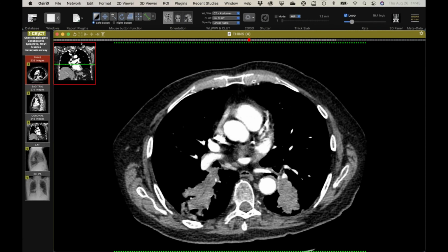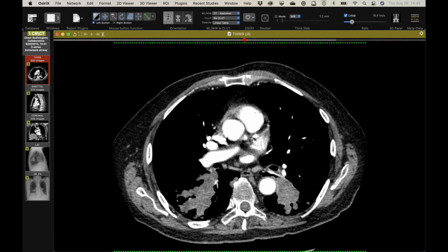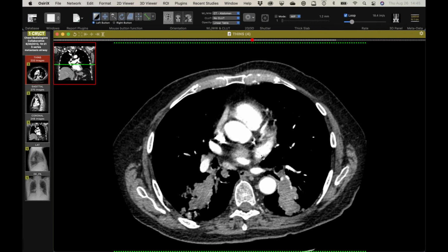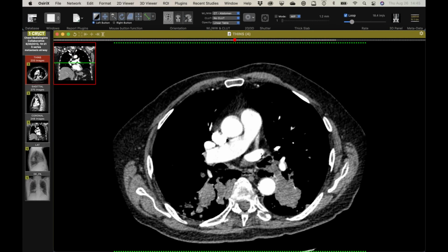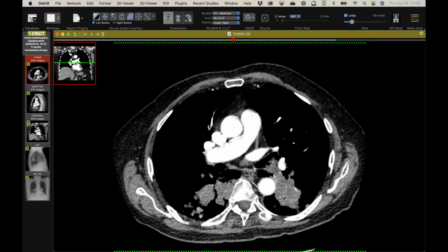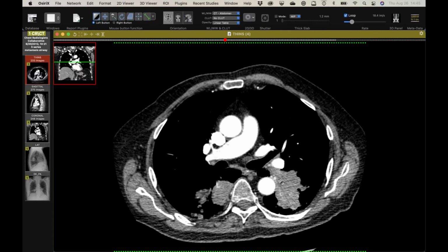So do you think most of that is tumor just growing within the airways and expanding, or do you think the tumor is more central and then there's mucus impaction? I think a lot of it is tumor, given how expanded it is. I mean, you don't typically see that much lumpy bumpiness when you have a mucocele or something. Also, it's pretty much the same attenuation.